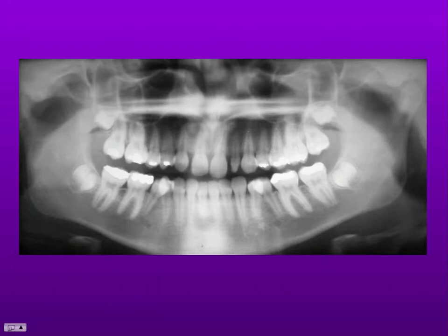Another patient. The 7s have erupted, the 8s are in development, so it's a teenager probably. What can we say about this patient? Well, if we count the teeth, we've got 8, 7, 6, 5, 4, 3, and 1. So we have a missing lateral here. 1, 2, we've got a peg lateral. 3, 4, 5, 6, 7, 8.